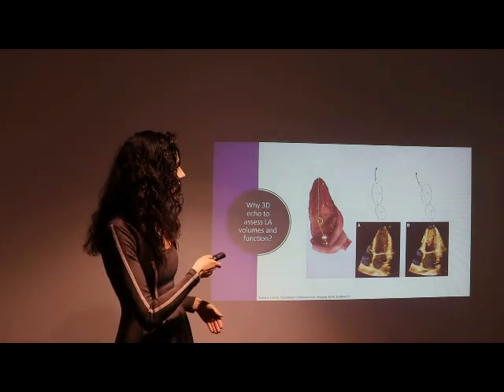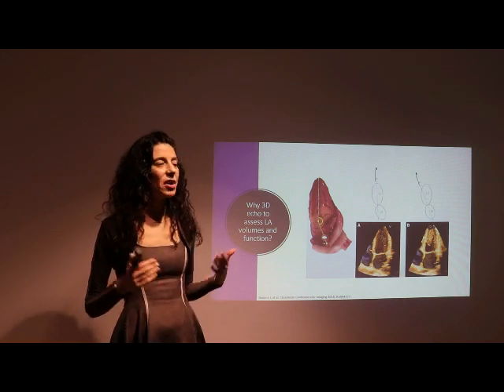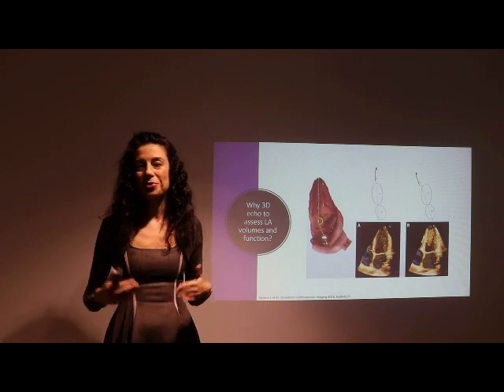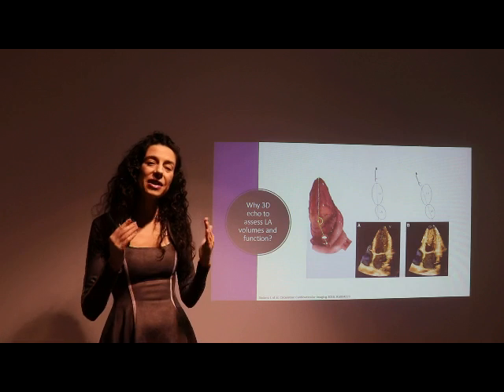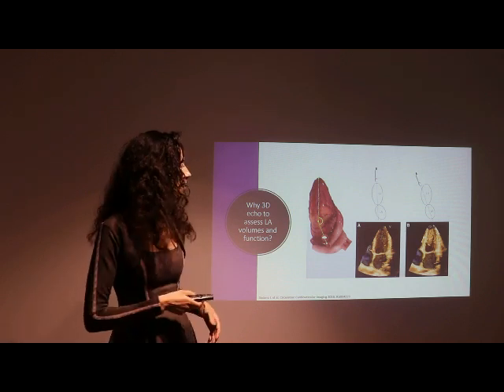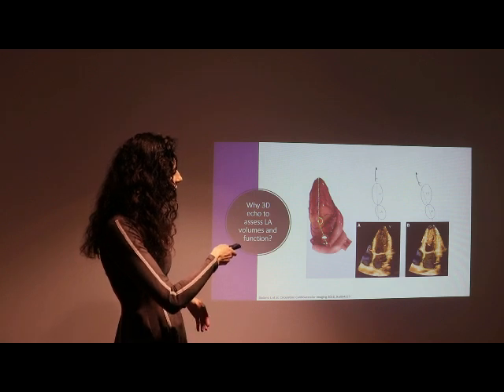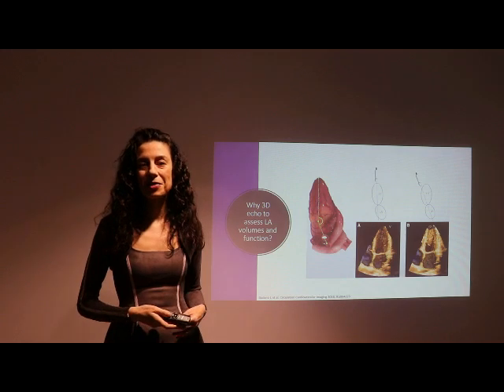You see there is a slight angle between them, and if you have the perfect apical four-chamber view for the left ventricle, then for sure you are cutting the left atrium, because you pass somewhere here and not from the maximal longitudinal axis of the left atrium.